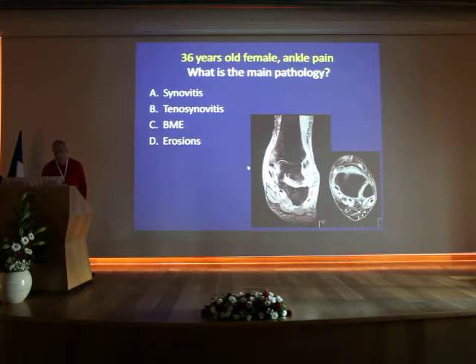Okay, so what will be most probable? Most probably, yes, it's tenosynovitis, because the bones look quite fine, the joints that are demonstrated here, like this one, like the medial subtalar joint, look quite fine. There are no erosions, and this is mostly tenosynovitis of the joints surrounding them.